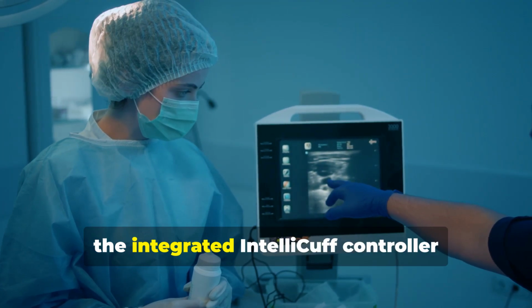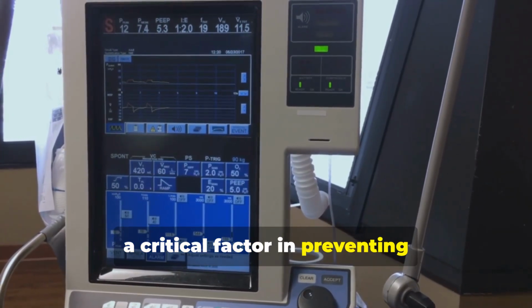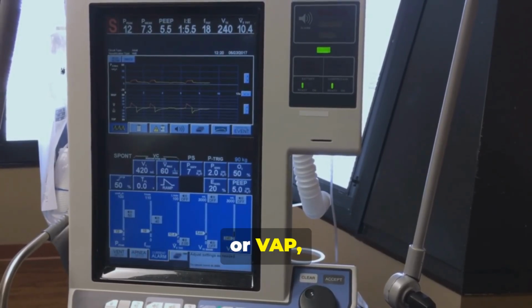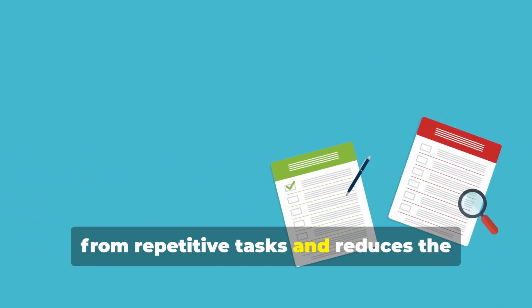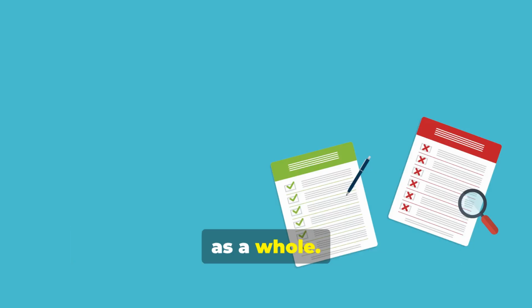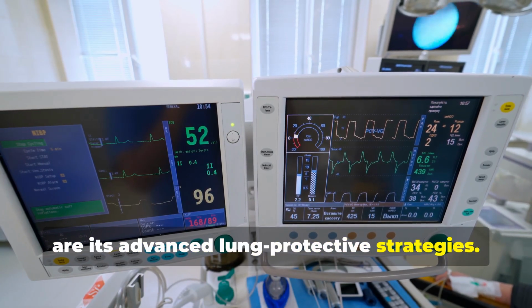Furthermore, the integrated IntelliCuff controller automatically maintains optimal tracheal cuff pressure, a critical factor in preventing ventilator-associated pneumonia, or VAP, by sealing the airway without causing tracheal injury. This constant automated vigilance frees clinicians from repetitive tasks and reduces the cognitive load, allowing them to focus on the patient as a whole. Central to the G5's clinical prowess are its advanced lung protective strategies.